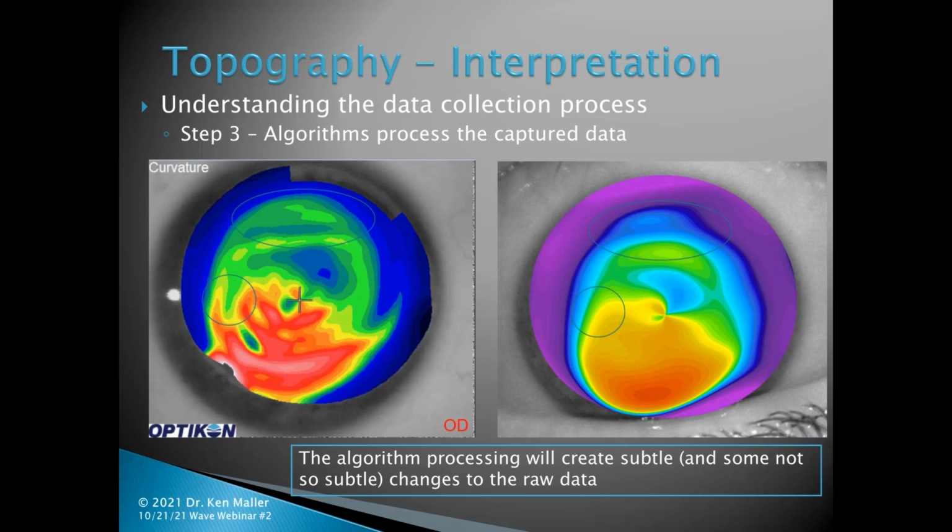So the data has been changed because clearly this is the exact same cornea. These images were probably taken within 5 minutes of each other. So I know the cornea hasn't changed, and these are both really good captures.